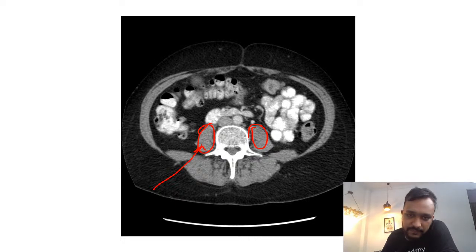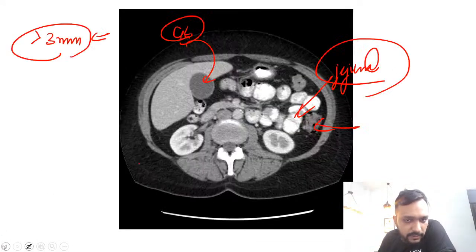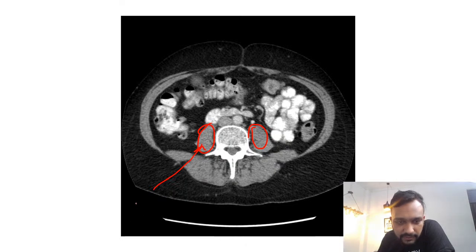Anyone? I showed you a kidney on a contrast enhanced image, where you can see the cortex and the medulla. This is how your kidney looks. So this is not kidney. This is a muscle that runs in the paravertebral space.